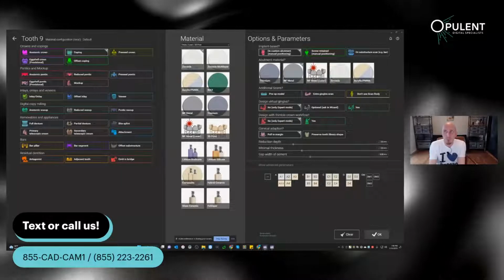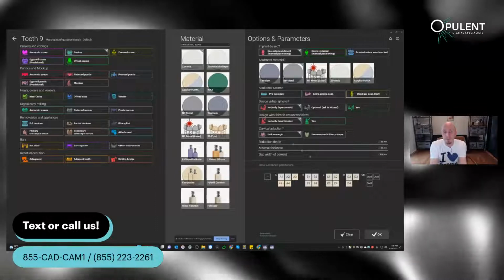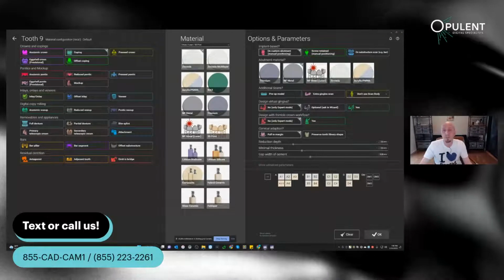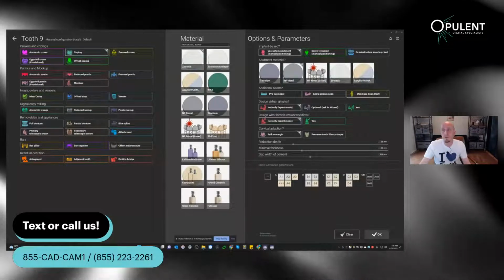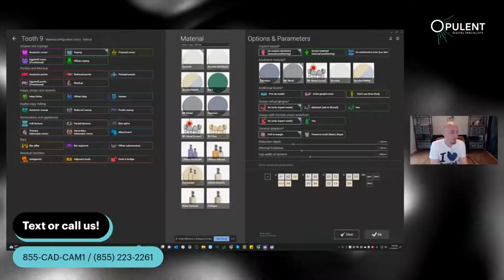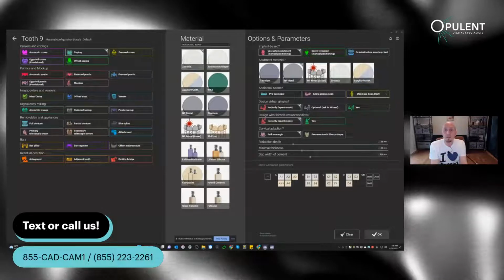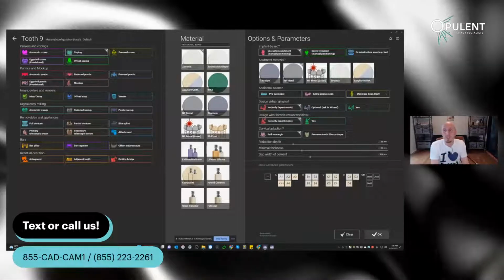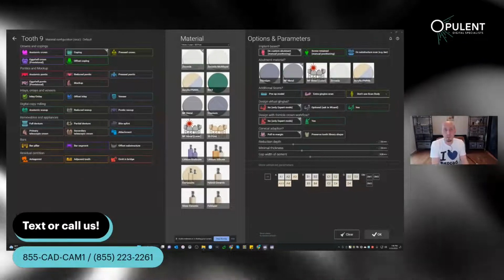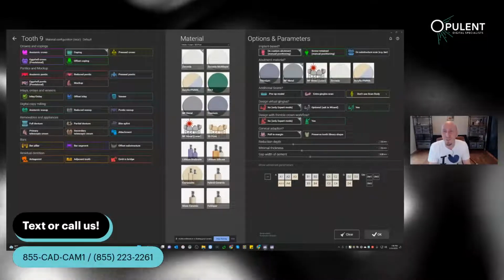So a good way of getting around this is basically treating your tie base like a crown and bridge case, if you want. Don't use scan body here, use manual positioning as a way out, because now you get to grind on your tie base on the top only, of course. Don't grind on your connection geometry, please. But you get to modify it, adjust it to the point where it needs it. It's hopefully still structurally sound enough that it supports your case. And you spray it, you scan it, use the manual positioning, and you call it a day, and it's Friday, and you get to go home into the weekend instead of working on a Saturday.